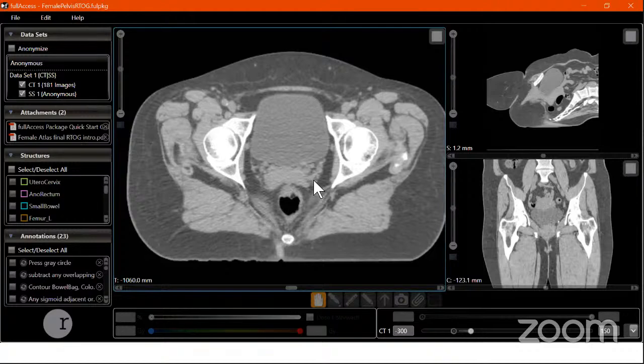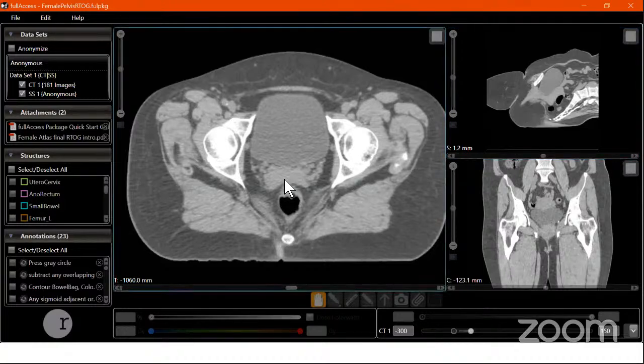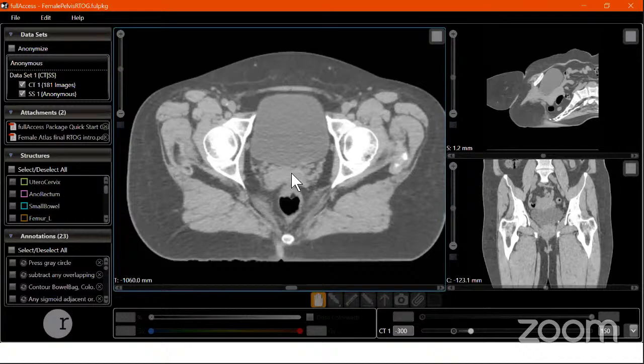When the cervix is grossly enlarged, the vagina might also be involved. The flat structure will not be very easily visible at this level when there is a large disease. In fact, the flat structure will come way down the line. Only a normal vagina appears flat, whereas much of the vagina that is involved by the tumor is all pulled up. You will not be able to see a flat structure here. That's one way of finding out that the disease is quite large and has involved a lot of the upper part of the vagina.